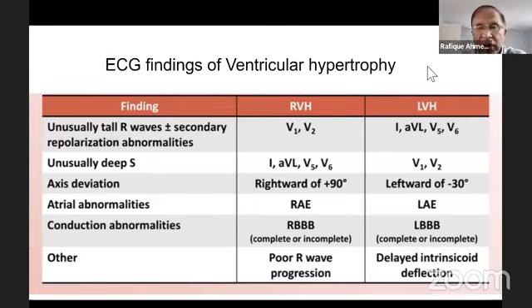The question is hypertrophic cardiomyopathy with short PR interval. It's not always present. It's just where the P wave is coming from. There are two factors. One is the P wave coming from really high up in the sinoatrial node or from the lower part of the sinoatrial node, and that will change the PR interval. Number two, AV conduction can be accelerated. And rarely you can have an accessory pathway, a nodofascicular pathway, to make the PR short. So that's about it. I just reported it as a finding without making too many comments.